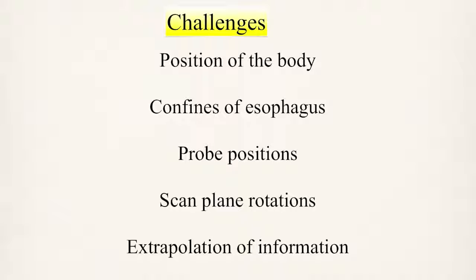The heart may be rotated in the chest and does not conform to standard anatomical planes, making probe positions and scan plane rotations more guidelines than gospel. Mastering these combinations and the subtle adjustments required to optimize image viewing can be extremely challenging. Finally, taking a two-dimensional image representation and extrapolating information on cardiac function and structure can be extremely challenging and requires a thorough understanding of anatomy and physiology.